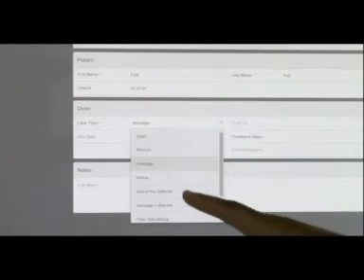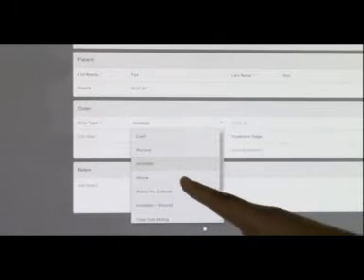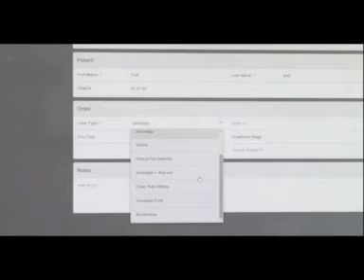Invisalign is for Invisalign. It's a closed file for Invisalign. You've got Vivera pre-debond. Can you guess what a Vivera pre-debond scan is? What would I use that for?